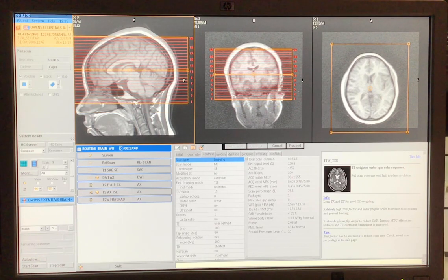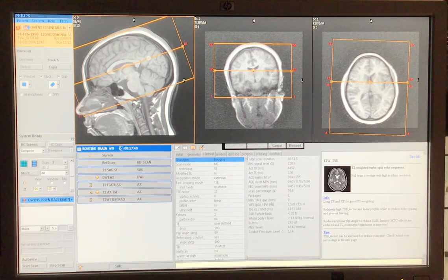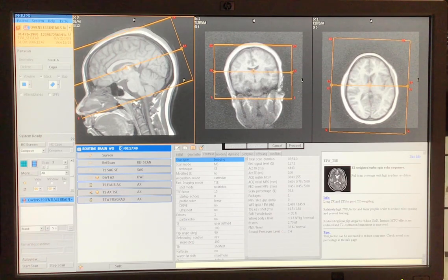I want to angle, and if you want to turn your red off, you can turn those red slices off, and you can say, I'm going to angle and draw a line from the genu to the splenium here. That's going to be parallel, right? I'm going to slice right through the center of that. Whether you are here or here, that's minute. Don't worry, it doesn't have to be perfect, I'm not going to go within 5 degrees of one or the other. But this is the angle you want.